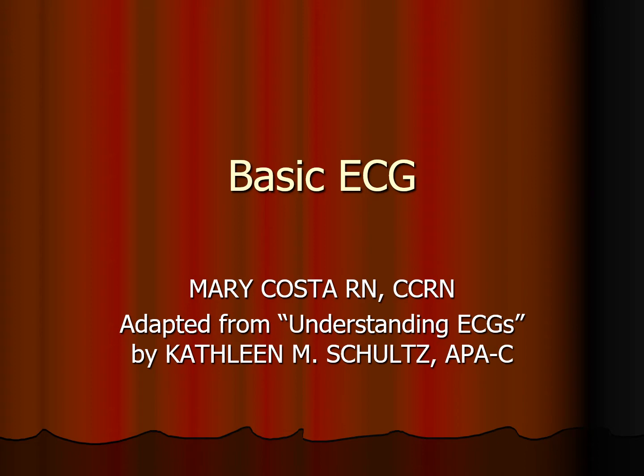Hey everyone. Okay, so we're going to be going over a review for basic ECG or EKG. I totally stole a lot of the pictures off this from Understanding ECGs by Kathleen Schultz. This isn't for any monetary gain. It's just a review for my semester 4 students at CCRI.